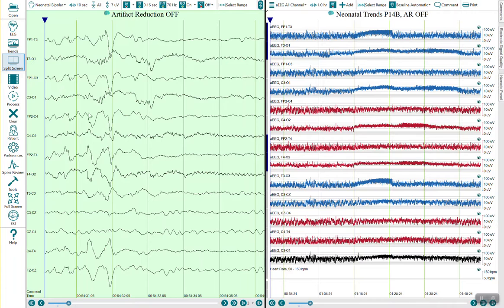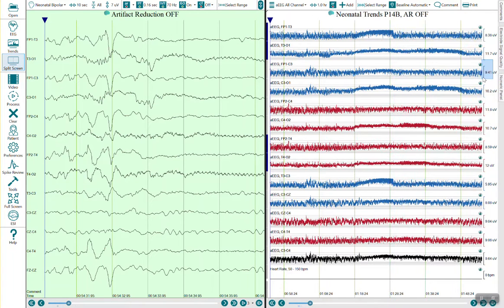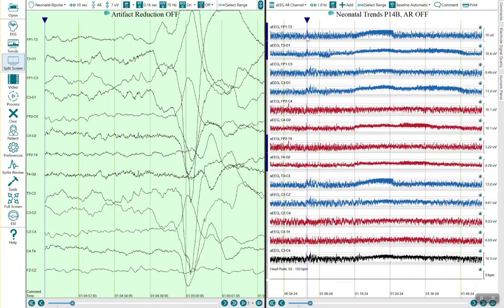It lines up pretty much with the montage that we're showing on the left, and look at those values. Now, the values that we're going to be looking at, when I right-click and select Show Values, those are going to be the maximum values. As we look at aEEG, we'll see that it calculates the min-max and renders that within the vertical epoch.